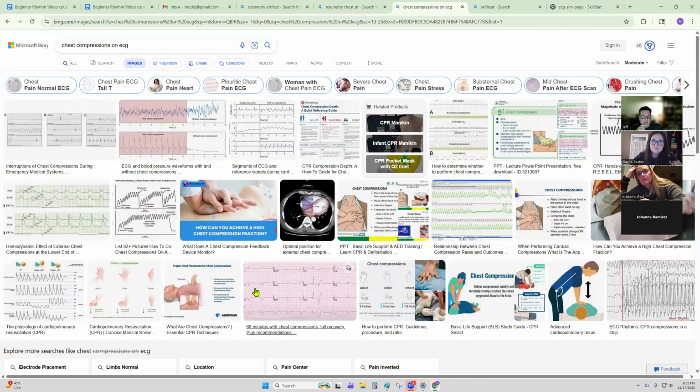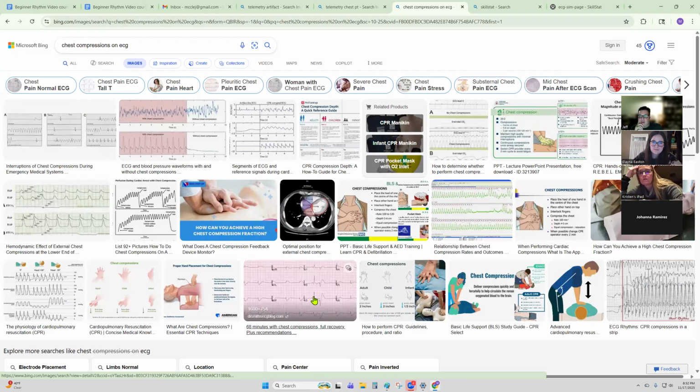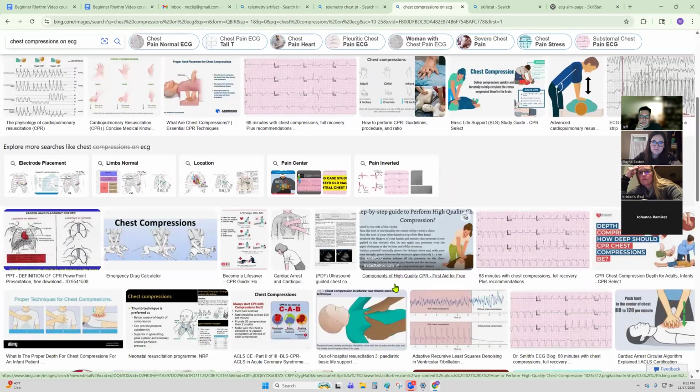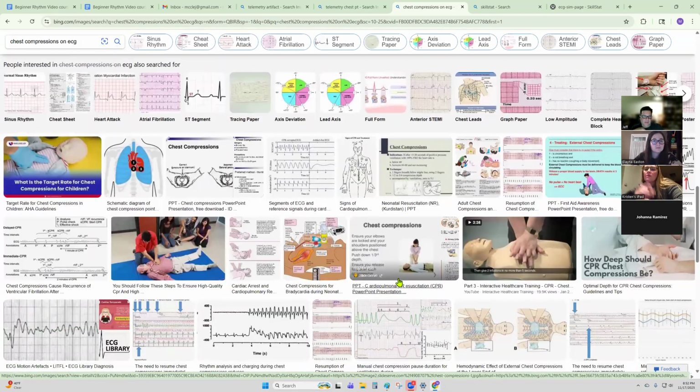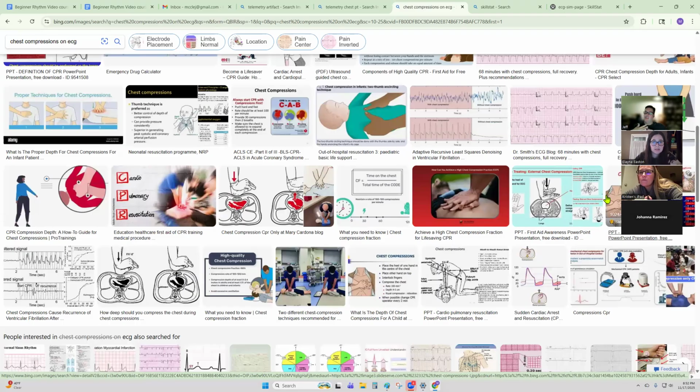The other one, I couldn't get an example of it, is chest compressions. I'm not gonna talk about it because I can't find a good example of it. There's like a certain look. If they're getting chest compressions, because they're pushing right on the heart, it's usually right on top of the brown lead. So on the telly, you'll see the brown lead.